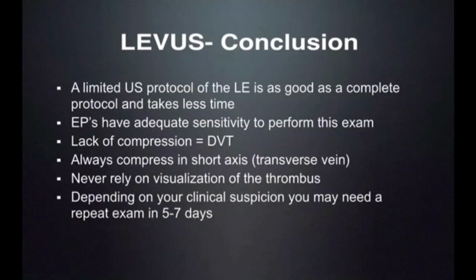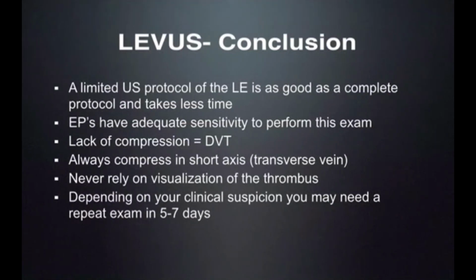So to conclude this lecture, a limited ultrasound protocol of the lower extremity is as good as a complete protocol and takes less time, so we don't have to always rely on radiology to perform these. Emergency physicians have adequate sensitivity to perform this exam. Lack of compression means this is a DVT. Be conservative when performing this exam. Always compress in short axis. Don't try to compress in longitudinal axis.